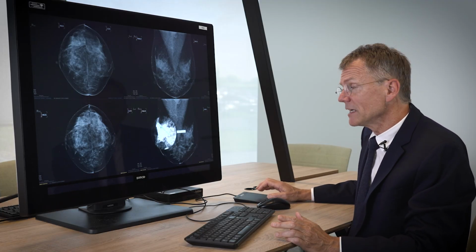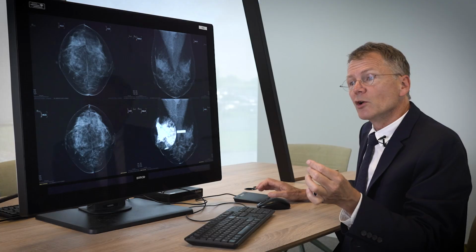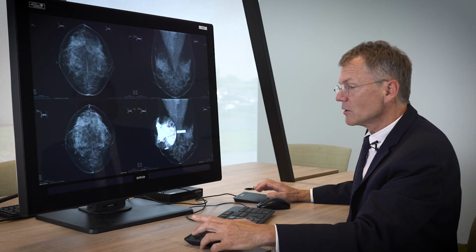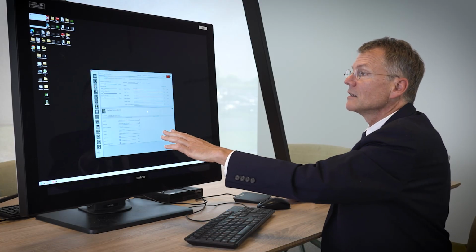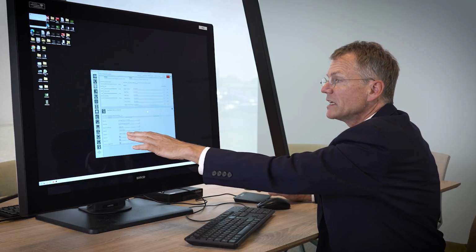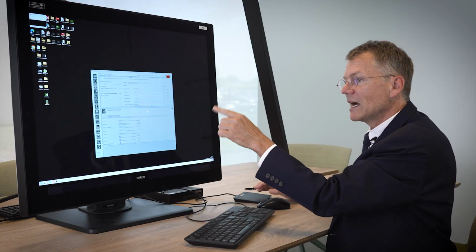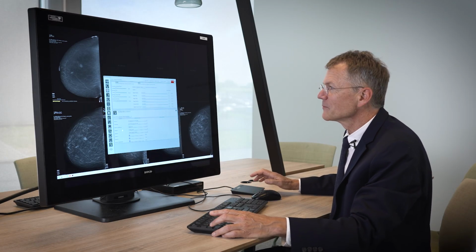So then the other thing I would do is show you how to use this with the ability to have multiple measurements, so that you can look at things where the prior is different than in the current case. Just to remind you, the touchpad, in the Barco system settings, explains that the second button will freeze the outline. And that's the thing you're going to do if you want to be able to make a second spot and a second outline and be able to compare the measurements. So let me switch to that.